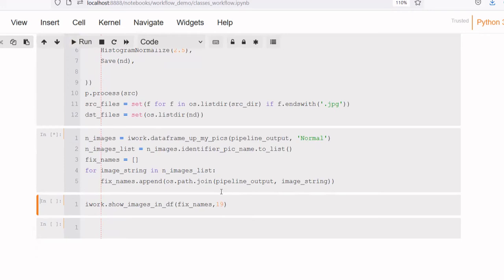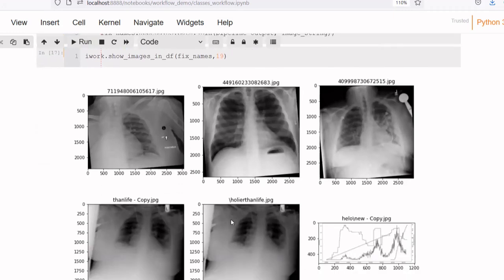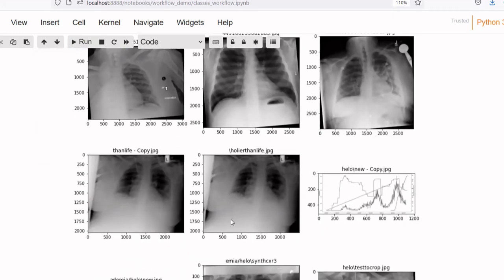This notebook is working with a very tiny group of DICOM, a pretty small data set of tabular data, and a very small group of images. However, these were picked so that the notebook would execute fairly rapidly, and some of the functionality of cleanX could be made obvious with very little computing power and very little time.